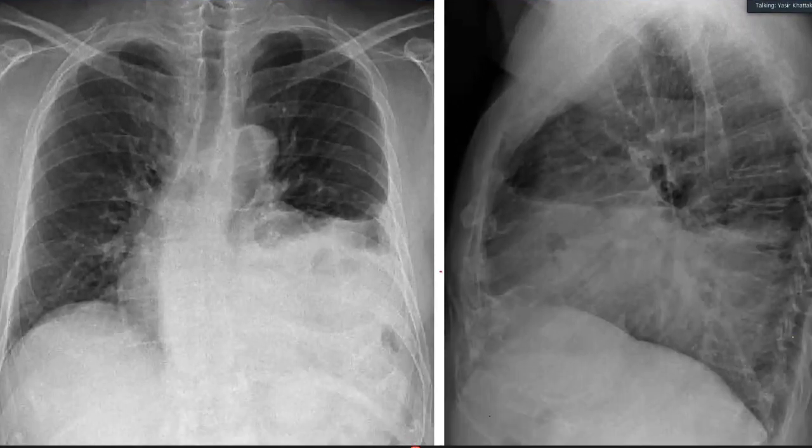But quickly tell me the findings. Within 2 lines, what's your diagnosis? So briefly, if I add both the views, frontal and lateral, on the lateral view I can see only one diaphragmatic line. The other diaphragmatic line is not visible laterally. So it means there is also some diaphragmatic pathology. Very good. So the diaphragm is a frontier organ.